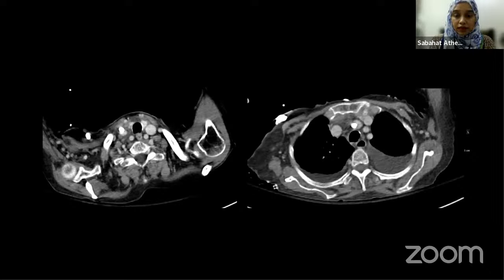So what we did, I can offer you a CT, as was rightly mentioned here as well. So I'm going to show you some selected images of the CT, and tell me what you see. Remember, we are trying to trace the central line. I'll keep it on the first image. Then I'll proceed later. So on the basis of the CT images, what do you think is happening?